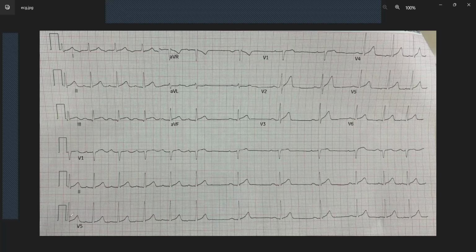And once you see an elongation, you need to see, is it consistent? Is it getting worse? Is it getting better? And then what we see is that we've got 1, 2, we've got long. It seems to be getting longer. And then we've almost got like a miss over here, and then we can see it shortens up immediately after that. So we've got this long and then like a pause, even though we don't see a P wave in front, and then we see that it again starts to get longer again. So we've actually got a Mobitz type 1 that's going on over here.